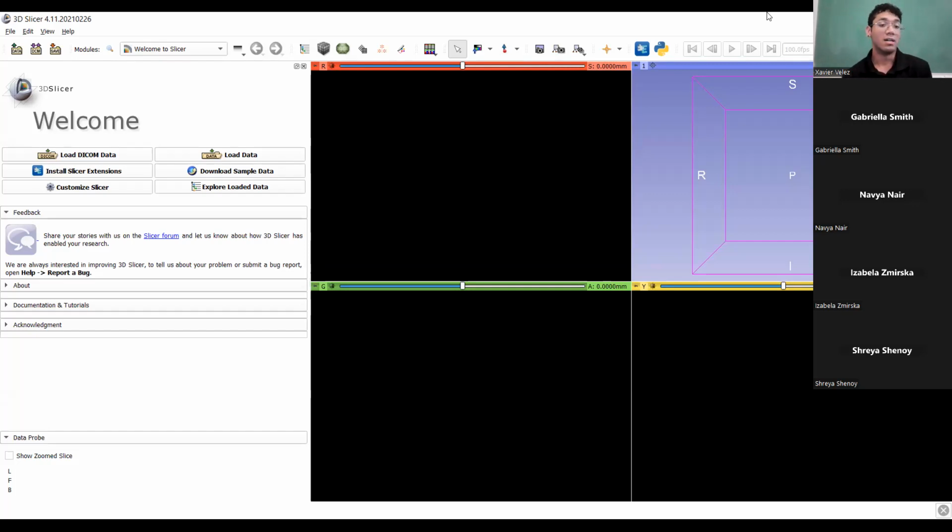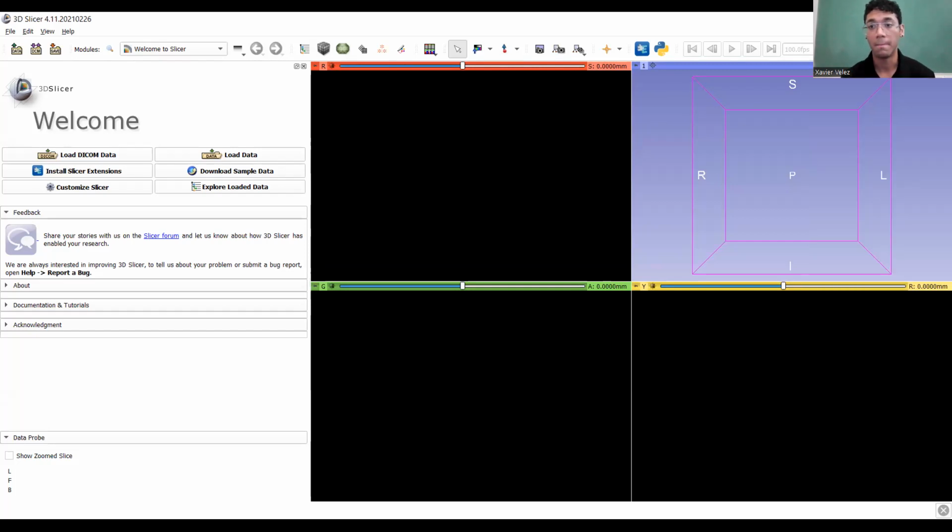So this is primarily useful if you are taking CT scans and want to model and design different defects, or I know we have our kidney team that does this, and I know cardiothoracic has done this a little bit as well. I'm not sure if surgical has, maybe. But it's a super great skill to learn if you ever find yourself with some CT scans and want to either model or 3D print some stuff.